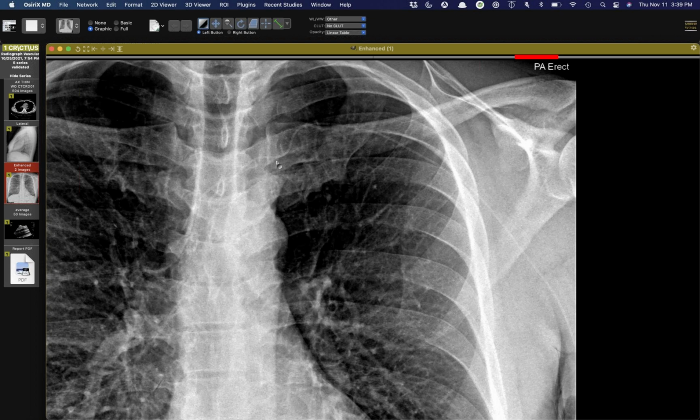So Paige made the observation that he thought this is often suggestive of thrombus of the vein surrounding the PICC. And he's seen this a couple of times in the remote past, and it turns out he was right in this case too. I thought he was crazy, but this guy had come in with 3 days of worsening upper extremity pain and chest pain and inability to raise his left shoulder.